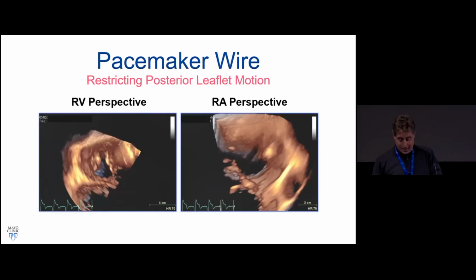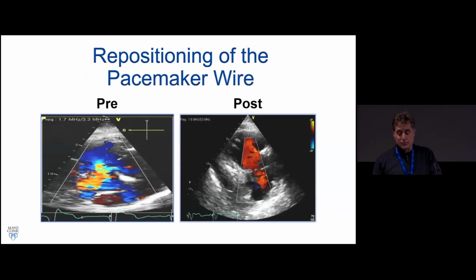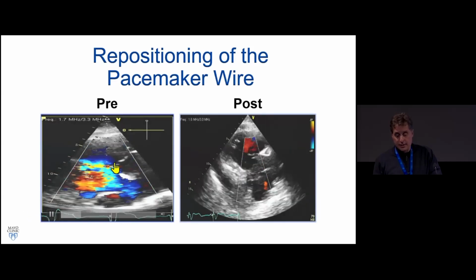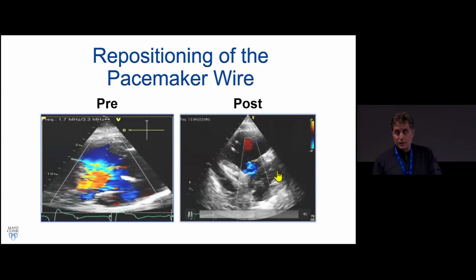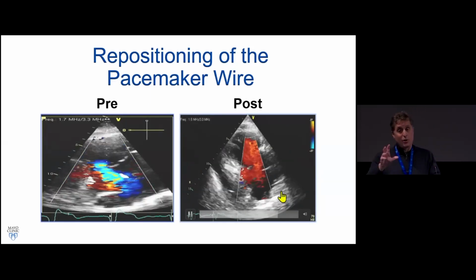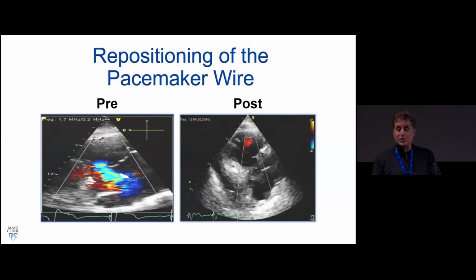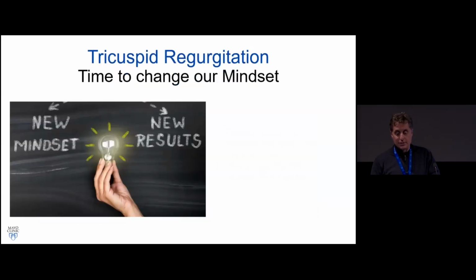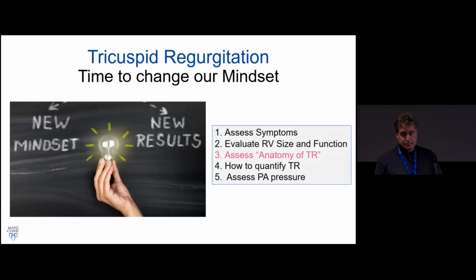And although not the easiest thing to do, what we asked to see if they could is to reposition the device lead, which they did. And we can see pre, and here this is post. This was a few years ago. We were just getting into this, one of the early cases that we did, but we had a great result. And again, it's not always easy to reposition the leads, but in this case, they were able to do that, and we were able to eliminate the tricuspid regurgitation.